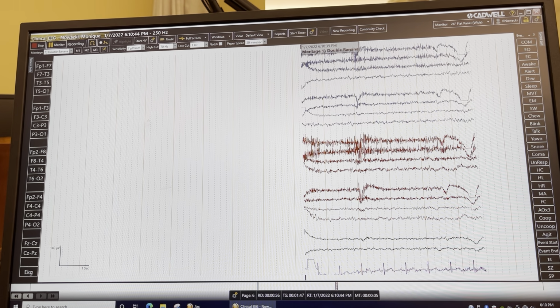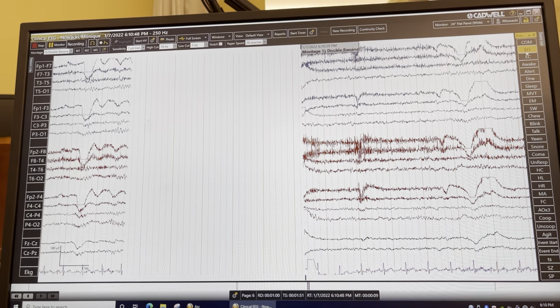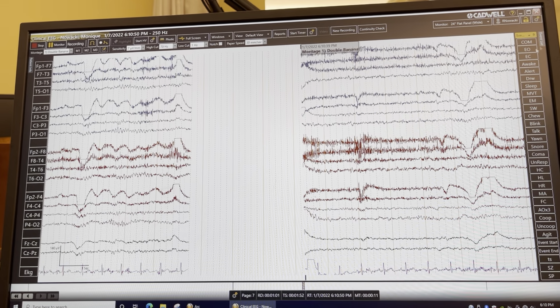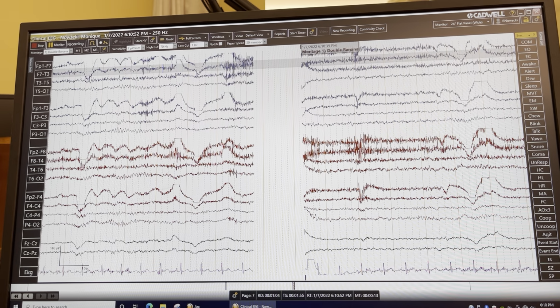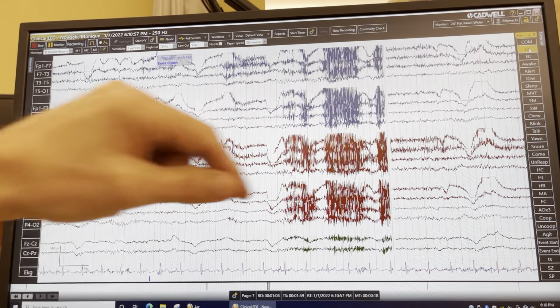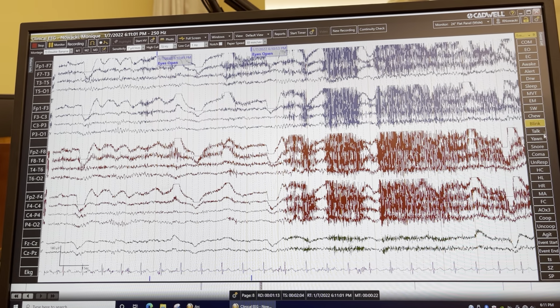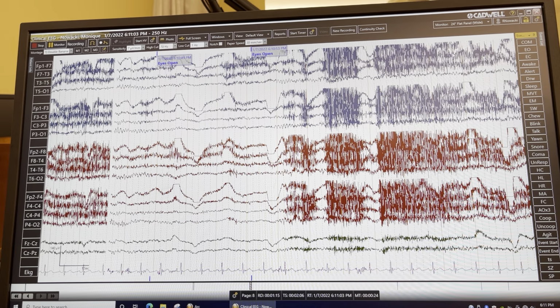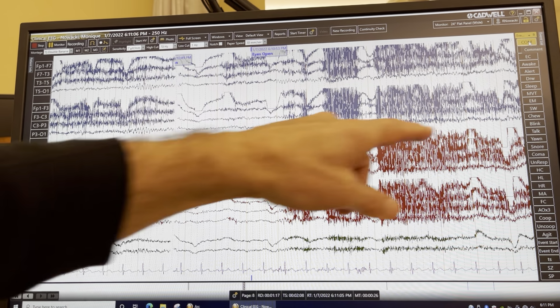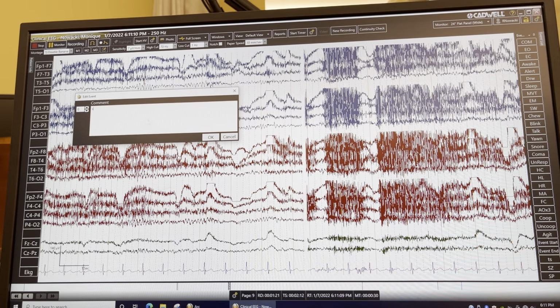And you can see here, you can click over here and drag. You can click eyes. Oh, you don't have to actually click and drag. You click on it like this. You just click on it, and then you can put it wherever you want. Eyes open, and then if you want to do a comment, you can click on there, and then hit. I'm just going to put supine.